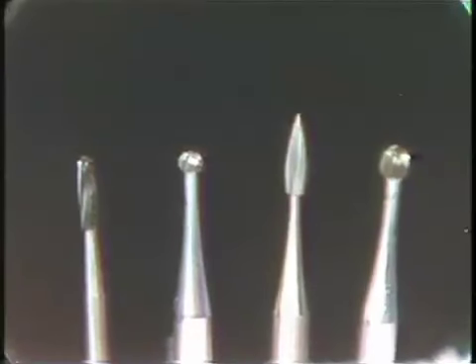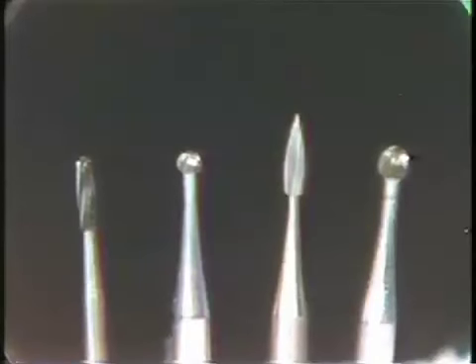The next burr over is the surgical length flame-shaped burr. This is used to smooth and flare the endodontic cavity preparations for anterior and bicuspid teeth. As was mentioned in lecture, this burr is not issued to you. You have to make this burr from the straight handpiece burr.